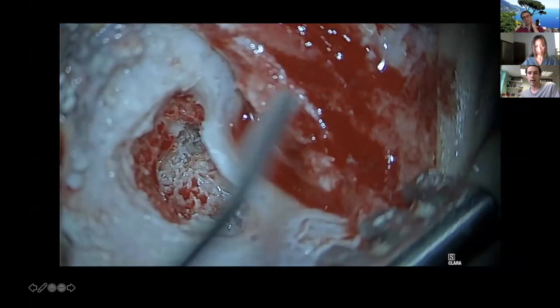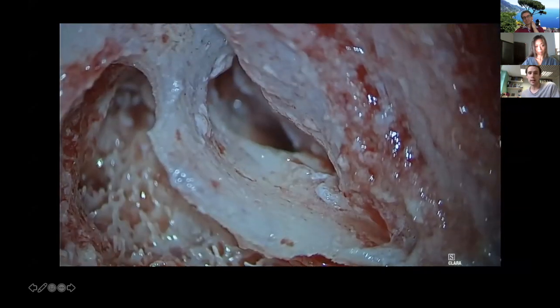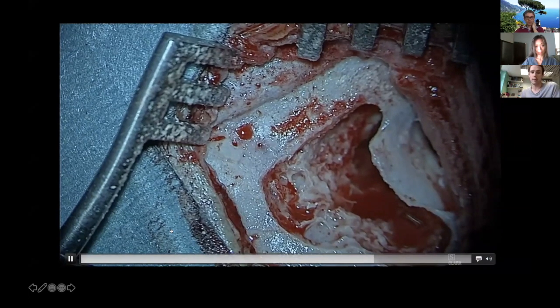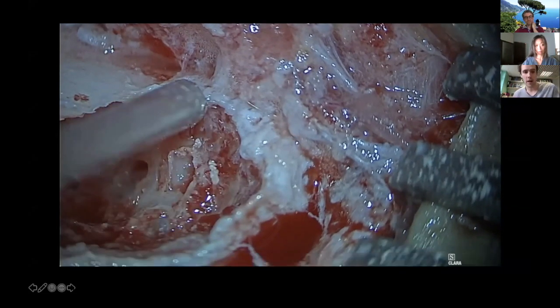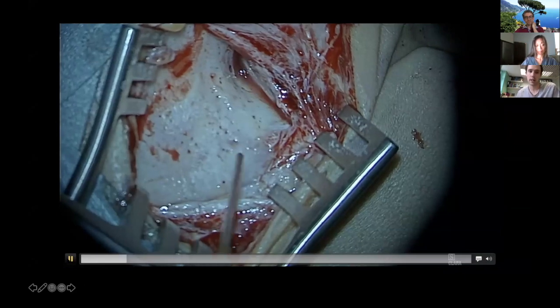So this essentially is just the very long-term sequelae of having chronic or multiple episodes of osteomyelitis, which have destroyed a lot of the temporal bone on this side and haven't been adequately treated quickly enough, as it were. And so the temporal bone has very little viable or intact tissue on this side, really.